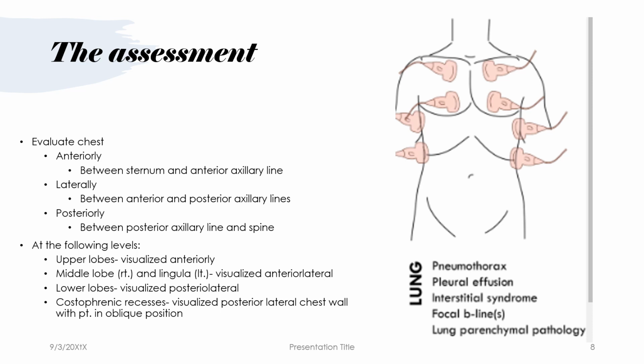So by working our way up, if a patient was in a supine position and we look in the anterior, we would be seeing more the apex of the lung area. As we work down and then towards the side, we're going to be looking more towards those costophrenic angles, and as we come more posteriorly, that's where we're going to be appreciating the diaphragm interface with the lung.